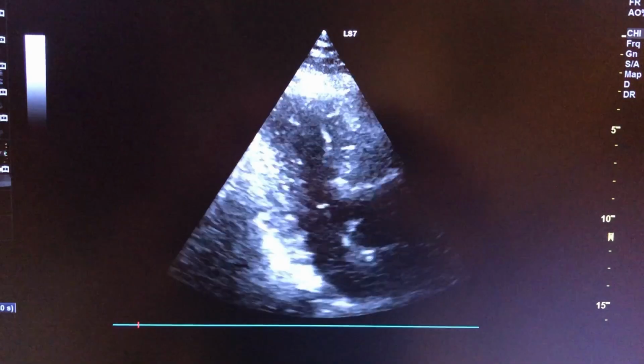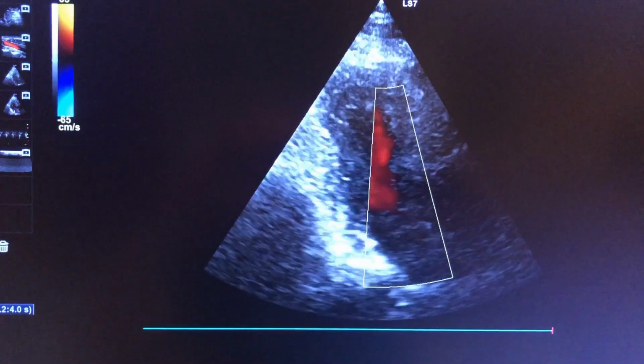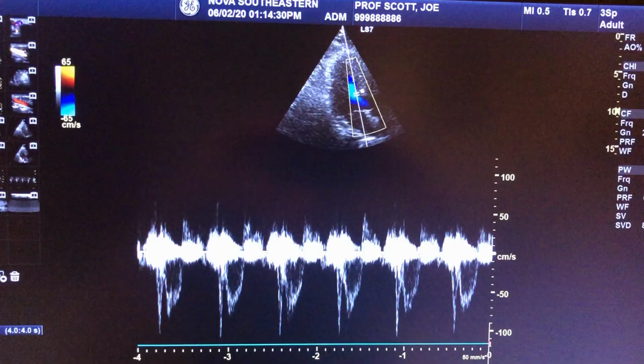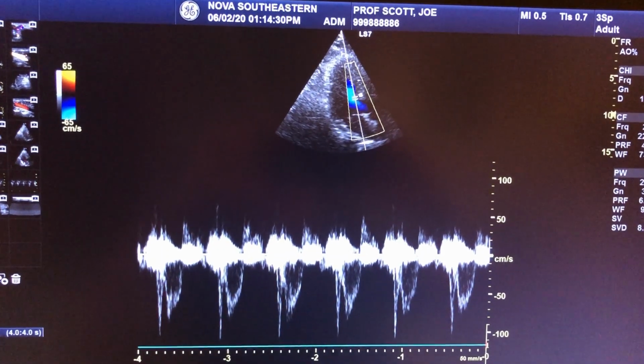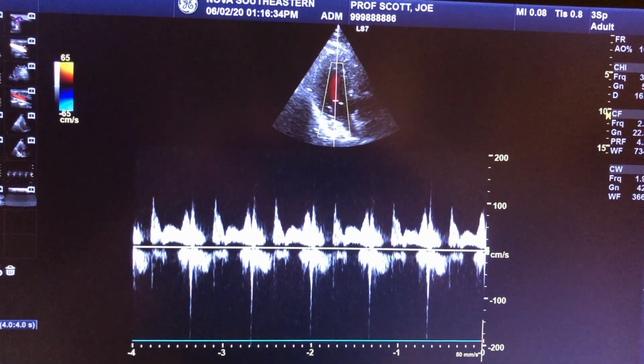Next, the sector probe. It's a phased array probe, technically. We use it for echo and for cranial. The sector probe, which is a phased array probe, is the only imaging probe that can perform continuous wave Doppler. The sector probe has a sector shape and can perform color flow, pulse Doppler, and continuous wave Doppler.